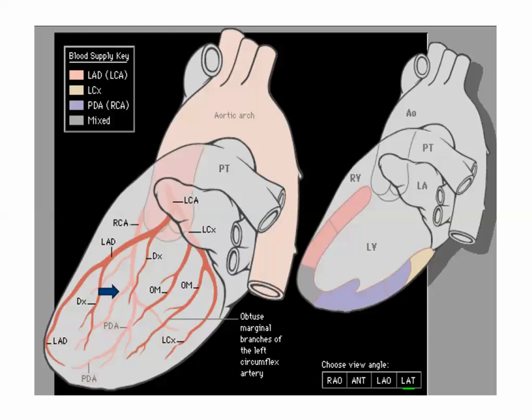This is the lateral. Which lateral, left or right? It's left lateral. This is the aorta, this is the spine, this is the shaft. So what will be here? LCX, near to the spine, to the aorta, to the shaft. And what will be here? LAD. In the lateral, what are the vessels? OMs above, and the most inferior will be the continuation of the LCX or the PDA. This is the inferior.